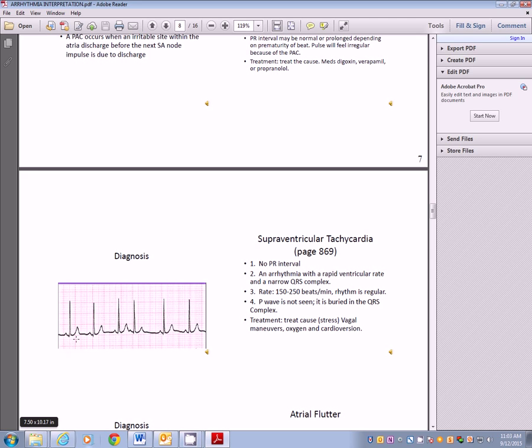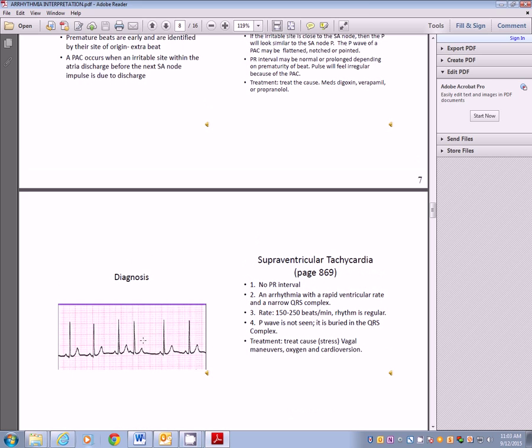So it's a completely normal thing. We have our PQRST, PQRST, and then we have an extra beat in here. Anytime everything looks normal, everything walks off except for that one extra beat, then you know that they have thrown what's called a PAC. Again, the P wave before that one can look a little bit different, distorted.